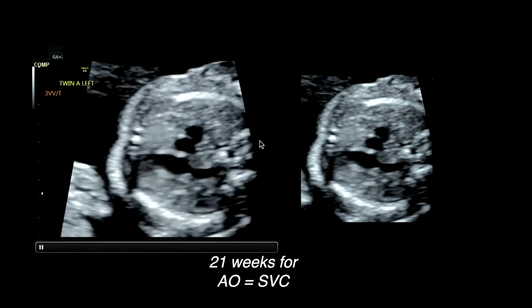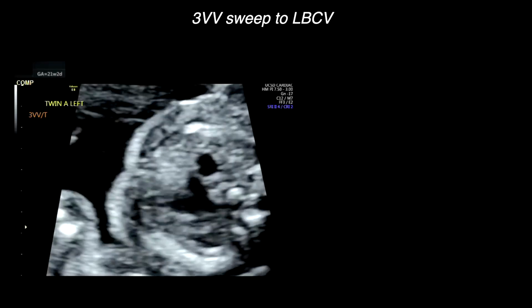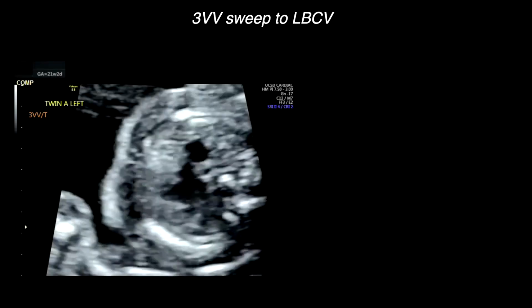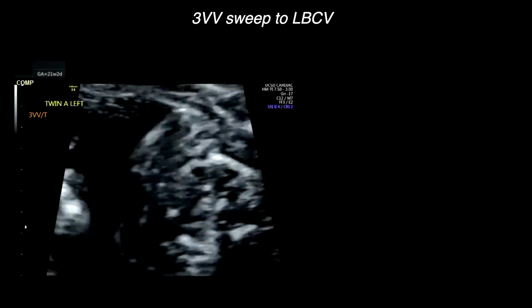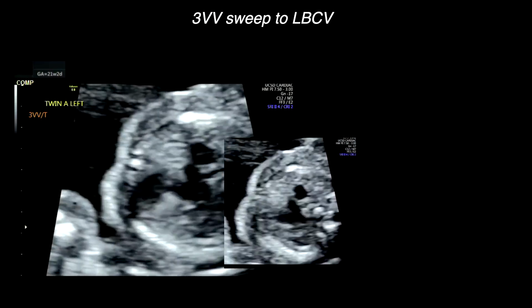So again, remember the SVC should be smaller than the aorta. So it looked like the aorta was about the same size, maybe a little bit smaller than the PA, but the SVC should be smaller than the aorta, which it was not. And as you come higher up into the left brachiocephalic vein, you can see indeed it does look large.